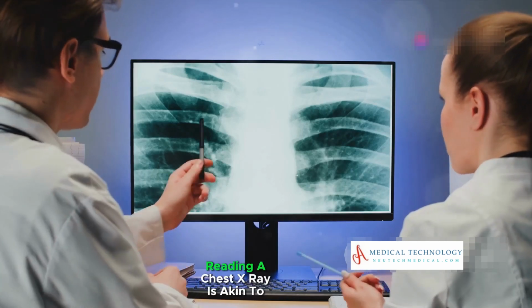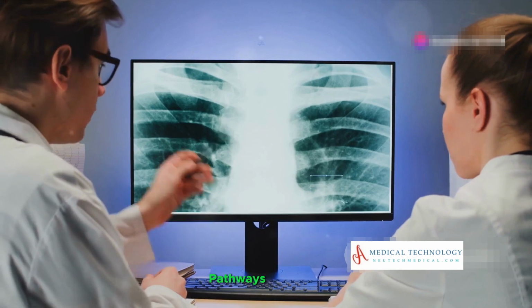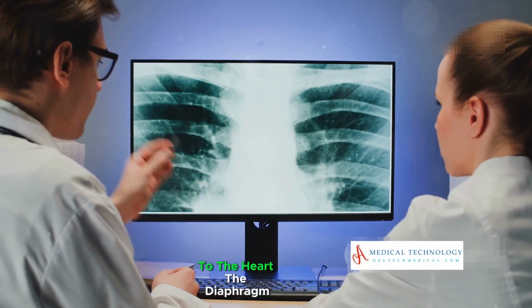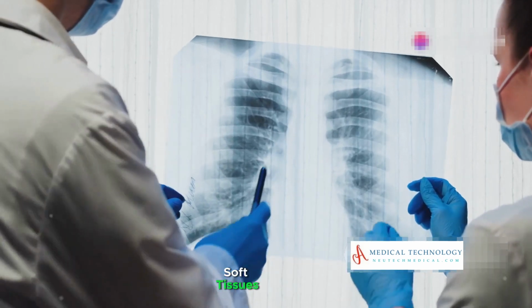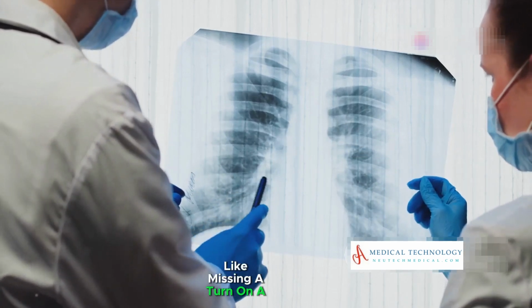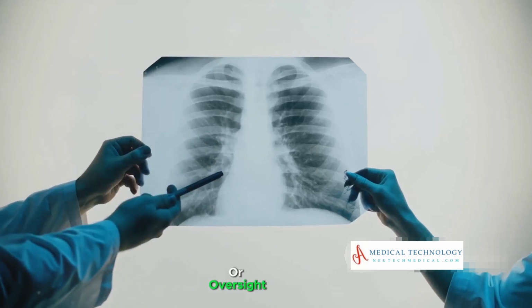In conclusion, reading a chest X-ray is akin to deciphering a map full of landmarks and pathways. Start with ensuring the quality and correctness of the film. Move systematically from the top of the lungs to the heart, the diaphragm, the bones, and then the surrounding soft tissues. Each step offers crucial insights, and missing even one can be like missing a turn on a meticulously planned route, possibly leading to misdiagnosis or oversight.